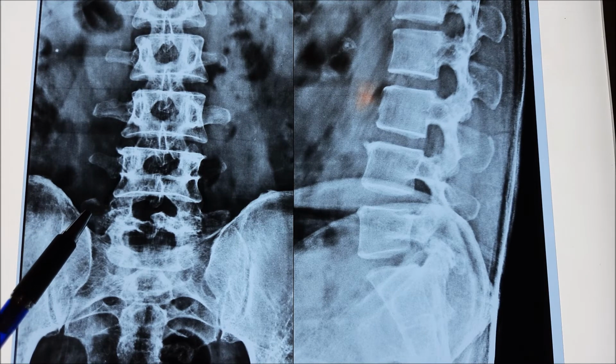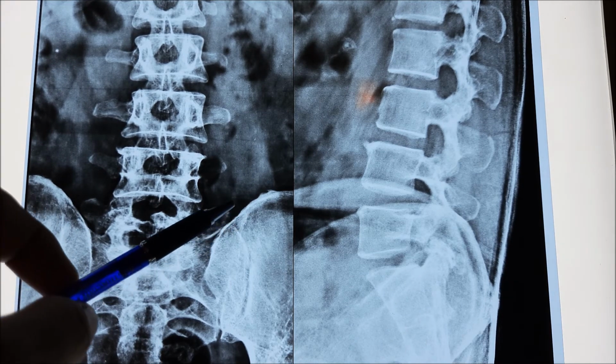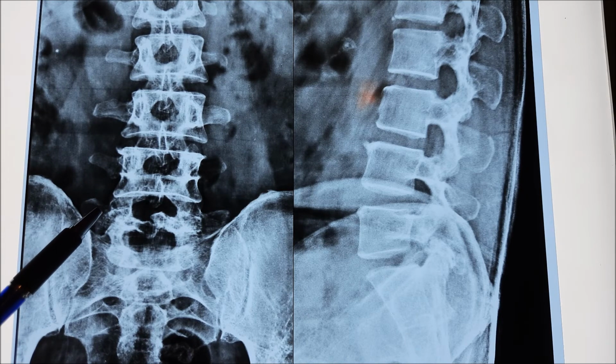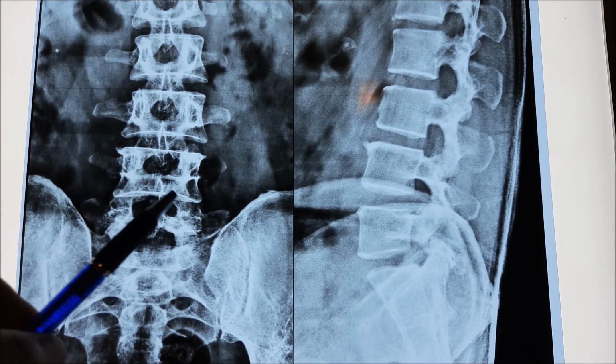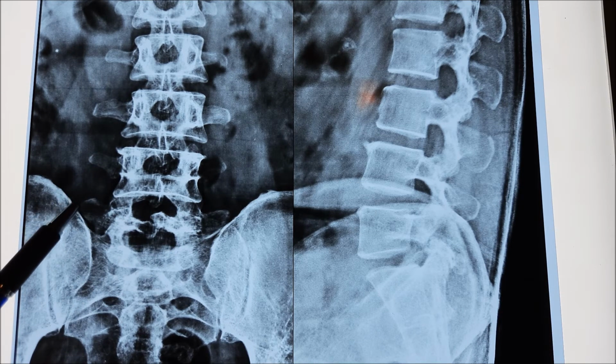But if you see the transverse process of the L5, see, this is the L5 transverse process. Again, it's about to touch the iliac crest. So there again there is a chance of friction and fusion of the L5 transverse process bilaterally. It's on both the sides. So bilaterally it got fused with, or is about to fuse with, the iliac crest, and this is what is called lumbar sacralization.